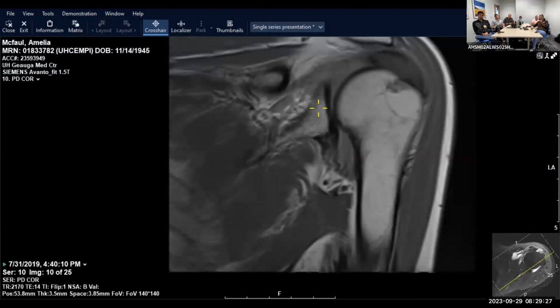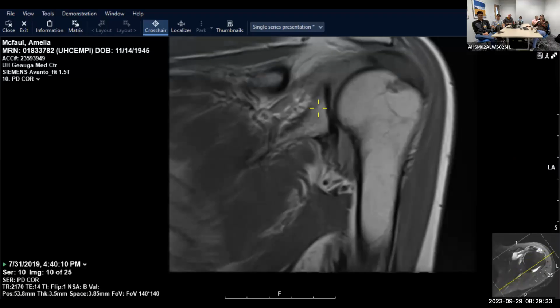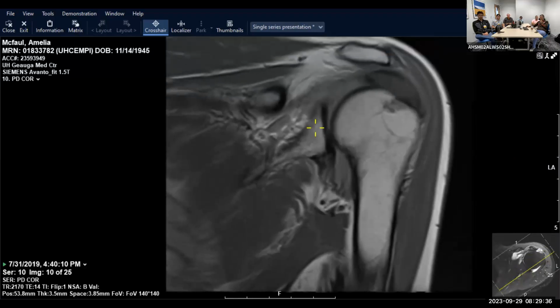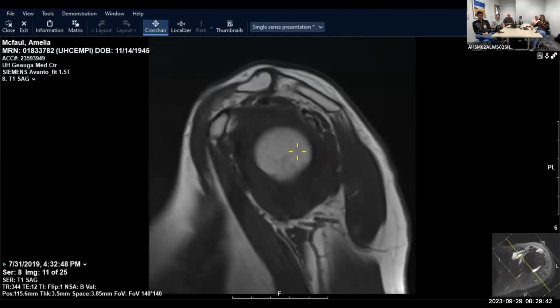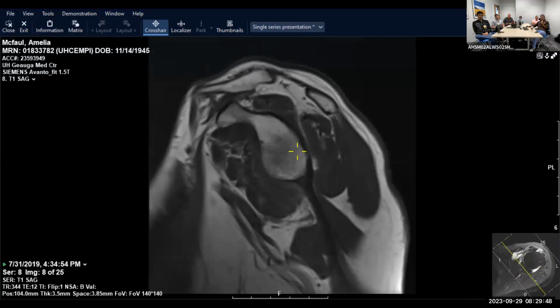This is in this area, axillary nerve, which innervates deltoid and teres minor. The most common cause of denervation due to axillary nerve pathology in this area is fibrous bands, which apparently we don't see that well on MR. So it's not usually that helpful, but we can still look for the teres minor and deltoid muscle issues.